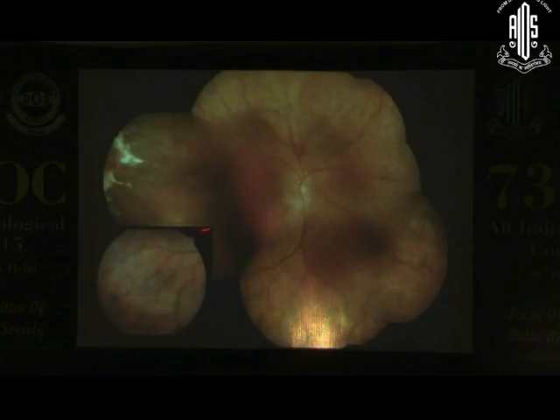But if you look at that, especially these peripheral arterioles, I'm sorry I don't have autofluorescence images that look much better, but there is something called a relative sparing of those arterioles, and that peripheral Coats-like response. A specific mutation called the CRB1 mutation can have this significant vascular change that is associated with rod-cone dysfunction. That's the other eye.